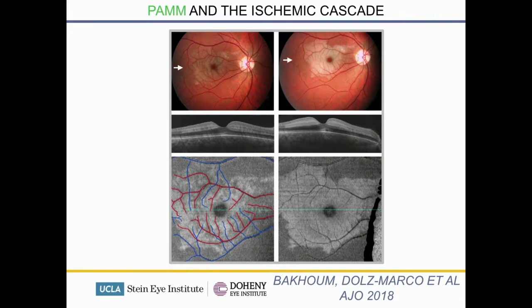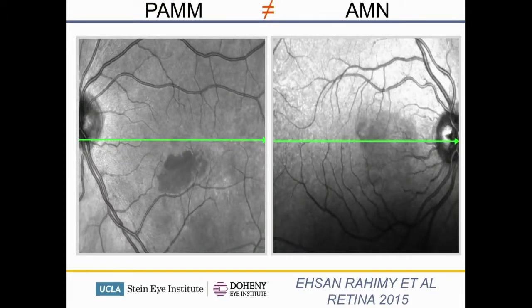In fact, in this patient, we can see the perivenular PAM pattern progress to a globular pattern. Other cases can even progress to intraretinal infarct, indicating that ischemia may develop at the perivenular pole first, which may be the perivenular pole of the deep plexus, which may be at greatest risk of oxygen desaturation.